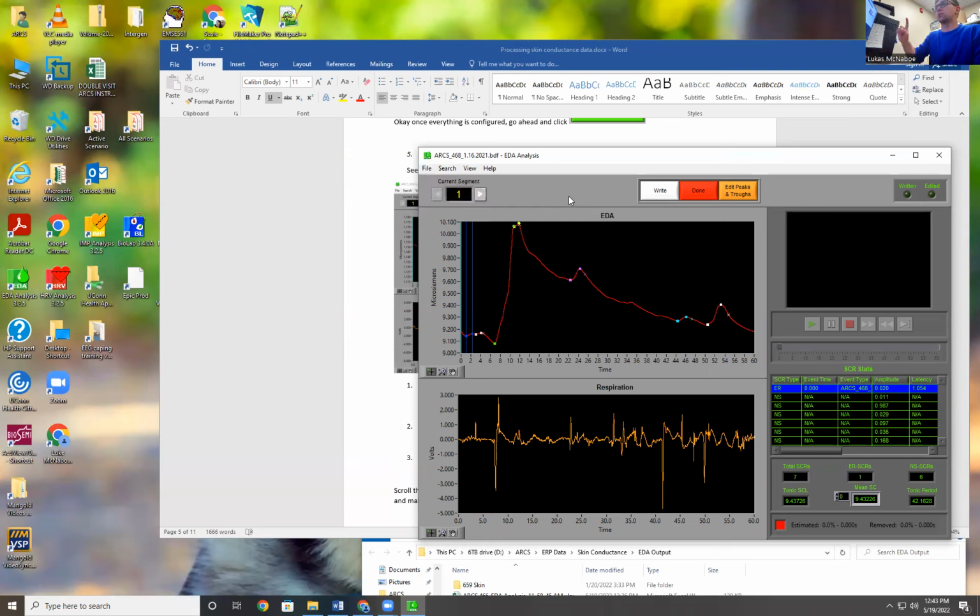There is one thing, actually, that we should probably get rid of on this here. This is saying that there is a little bit of a skin conductance response within the realm of the start. So you see how this says acquisition start there? It's calling that as an event, which is not. The events for the visits are like showing pictures of faces, animals, and this isn't meaning anything. So we should probably delete this.